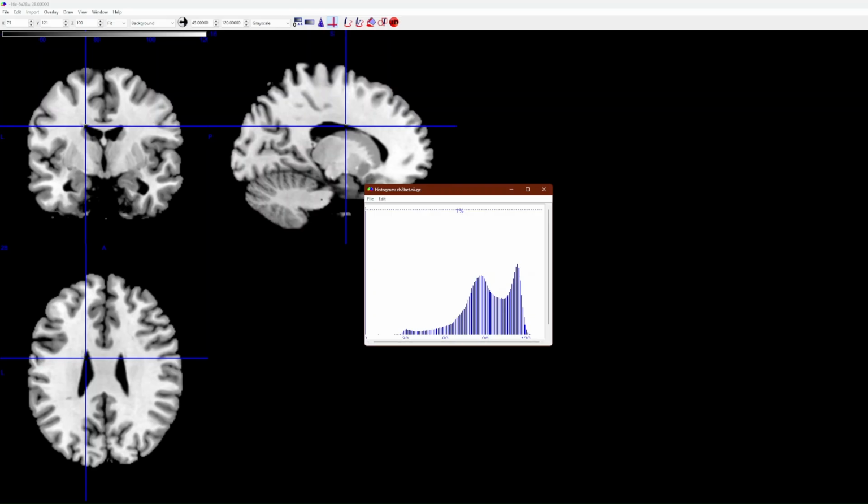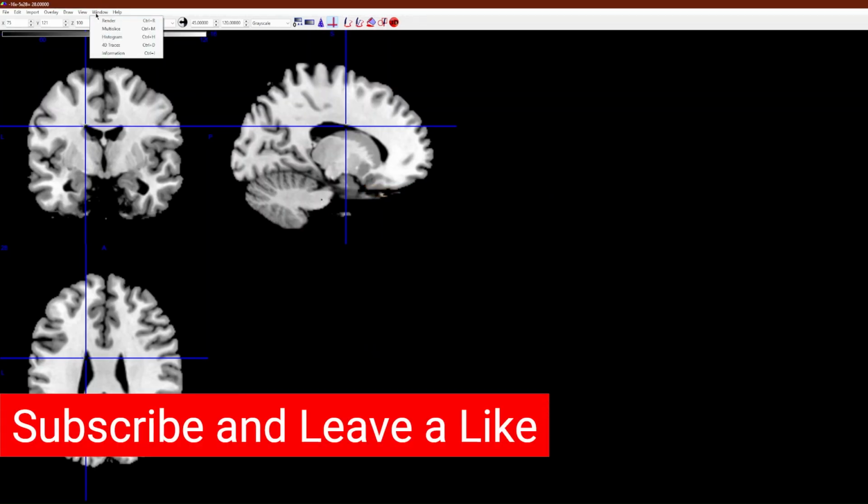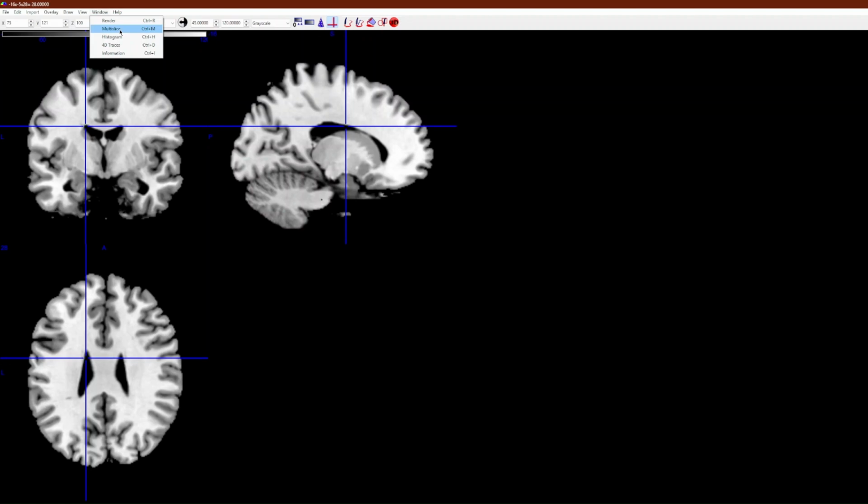So this is the final video on MRIcron, and there are other tools like 4D traces as well that you can look at on your own. But these are probably the most useful tools, especially multi-slice, which is used in a lot of studies, and render as well.